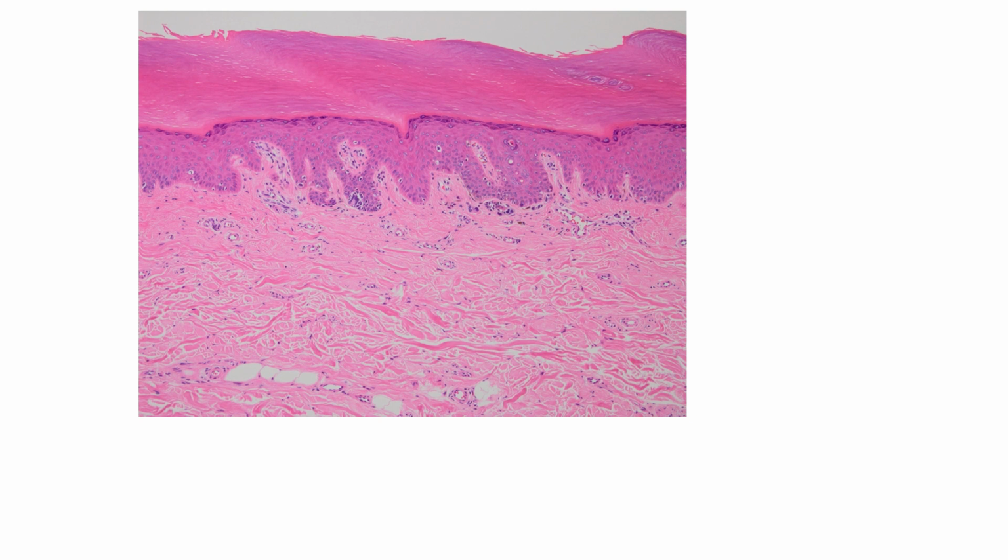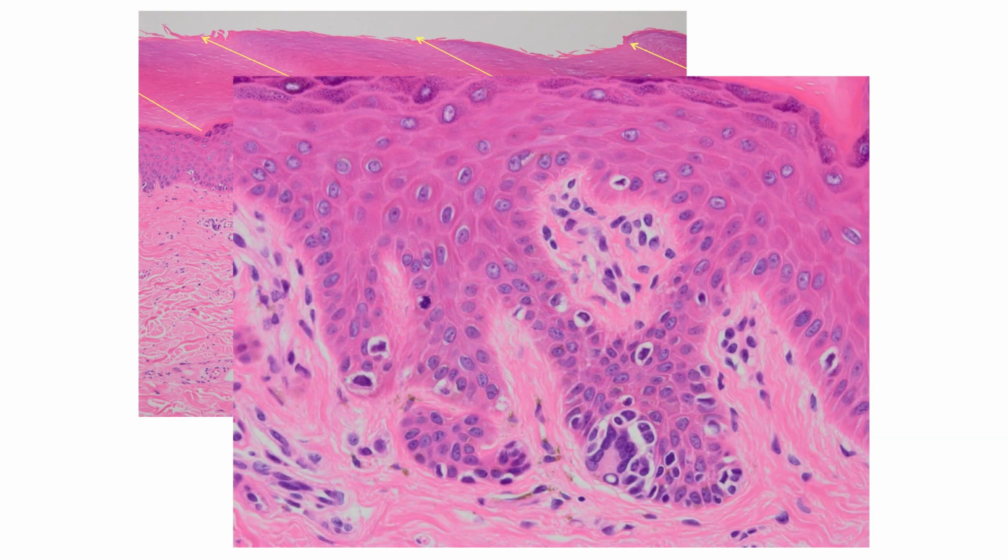Histopathologically, as expected, the cornified layer is obliquely arranged. An increased number of solitary arranged melanocytes is detected mainly in the crista profunda intermedia. The nuclei of the melanocytes are large and hyperchromatic. Thereby, this lesion is histopathologically diagnosed as acral melanoma in situ.